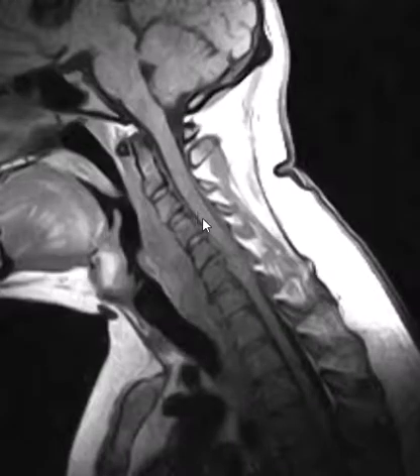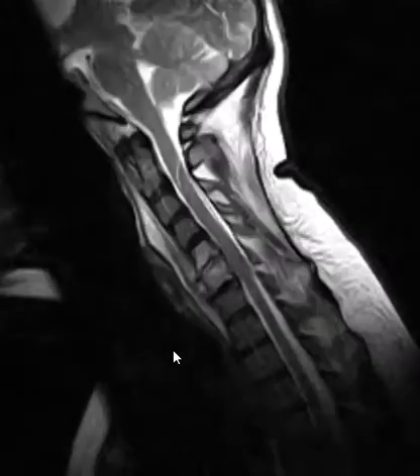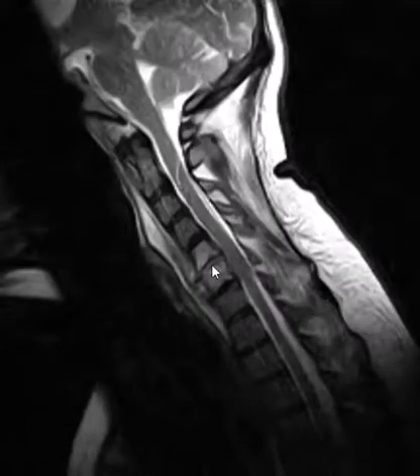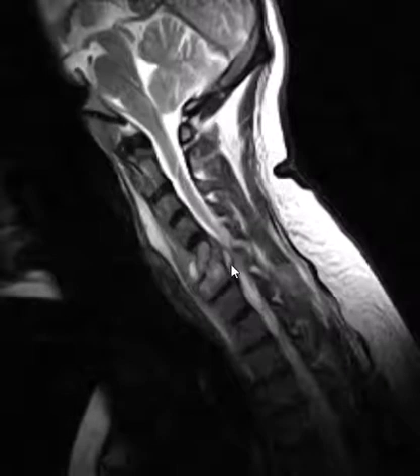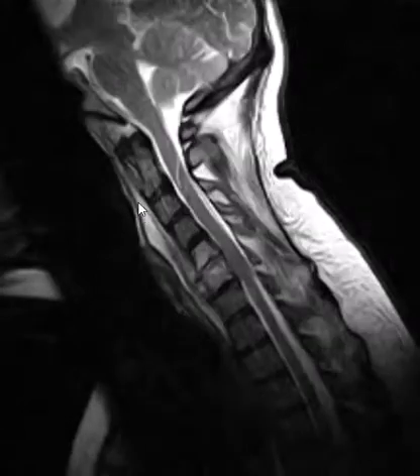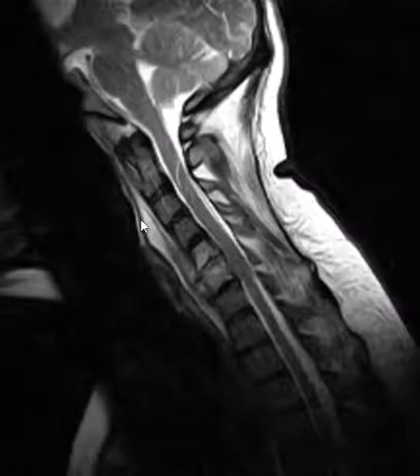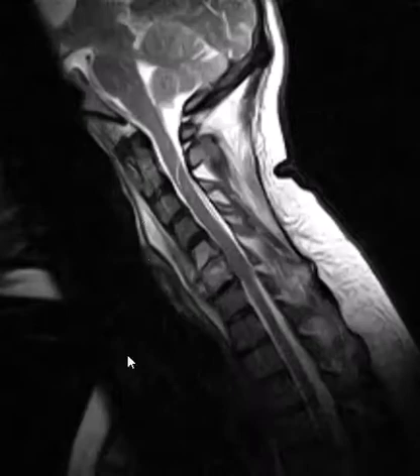Also, you can see the spinal cord is poorly defined down here. There's something in the epidural space here in the front, pushing on the spinal cord. On this T2 weighted sequence, we can see that there is some bone destruction, really prominent marrow edema in the vertebral bodies here. You see a little bit of fluid along the anterior margin here, also a little epidural abscess over here on the right-hand side, causing severe foraminal stenosis. And also in the front here, we see a little abscess. The prevertebral soft tissue space has this diffuse thickening and edema, and this little fluid collection looks like an abscess.